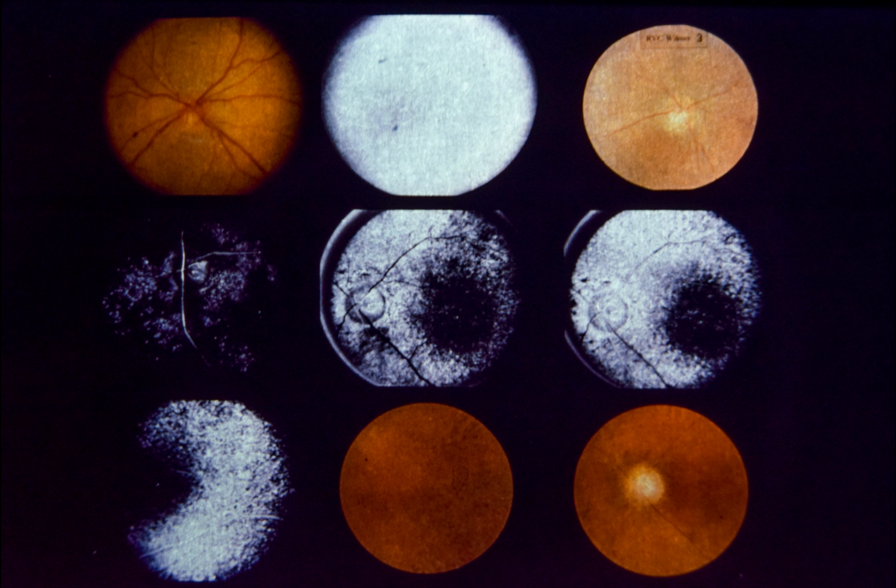We presume that the ophthalmic artery, rather than just the central retinal artery, was occluded, since the widespread pigment epithelial changes seen in this patient are not seen with central retinal artery occlusion alone, because the central retinal artery does not supply the retinal pigment epithelium. Left eye vision has remained bare light perception for 4 years.